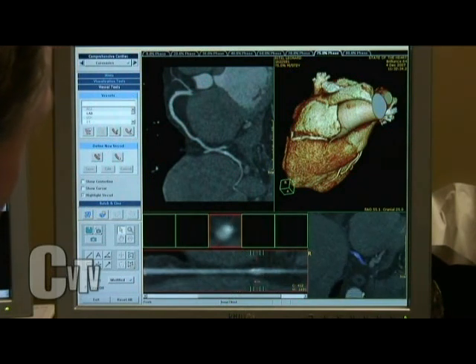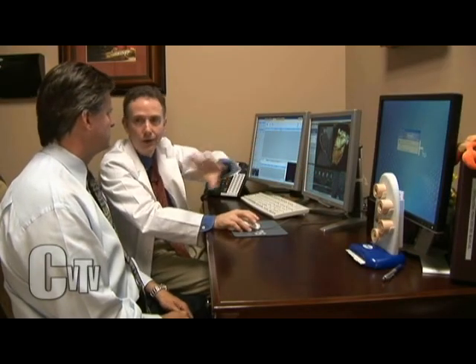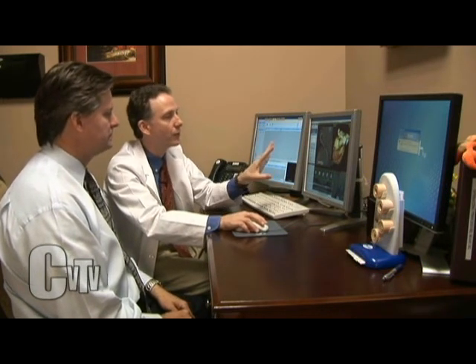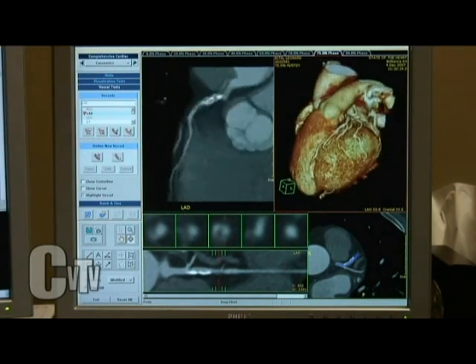He's got some calcified plaque here. This is not the kind of plaque I'm worried about. And as we treat the plaque elsewhere, all the plaque everywhere, both in the heart, in fact, everywhere else in the body will get better too. Wow. So fortunately for him, the real hot spot is that area right here. And it's one you're treating and following, and yep.